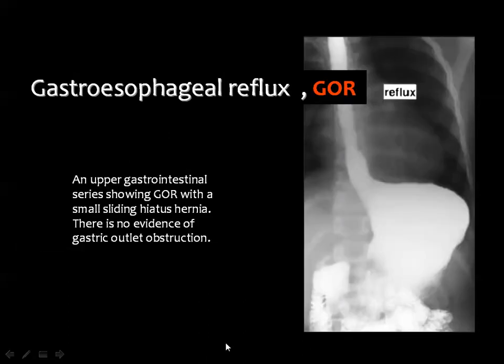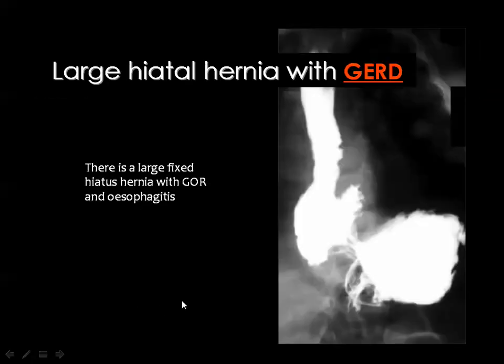Then during normal conditions, after the child swallows the food or barium, there should not be residual barium in the esophagus in the resting phase. But if you look under screen control, and you see barium almost totally filling the esophagus, or even filling the lower part of the esophagus, then you consider the possibility of gastroesophageal reflux.